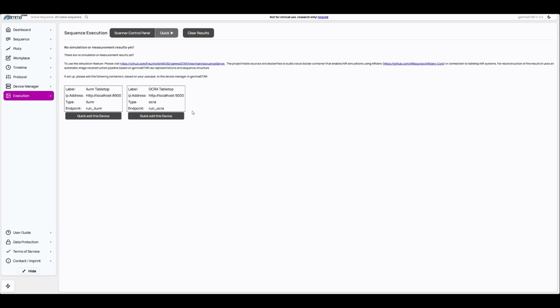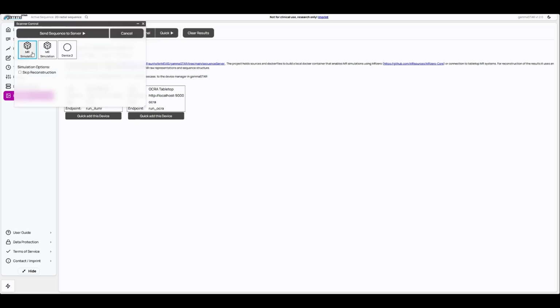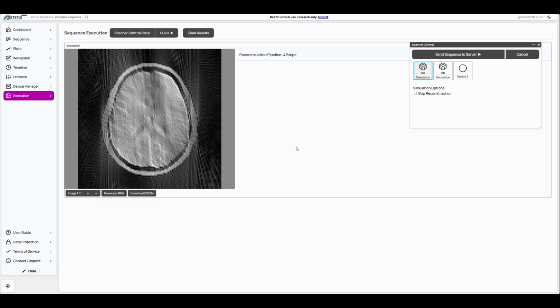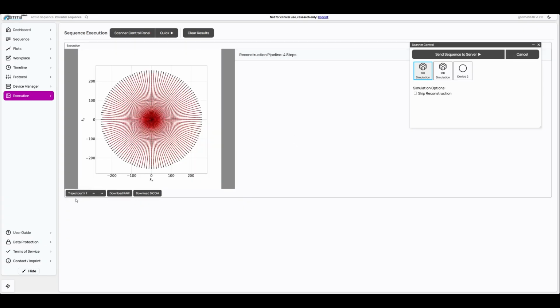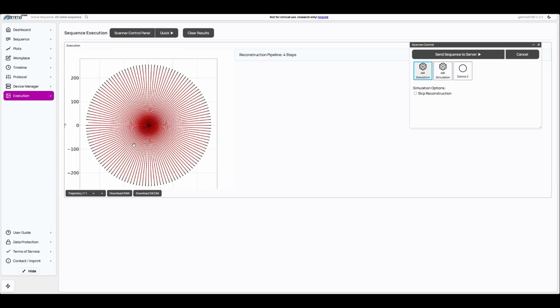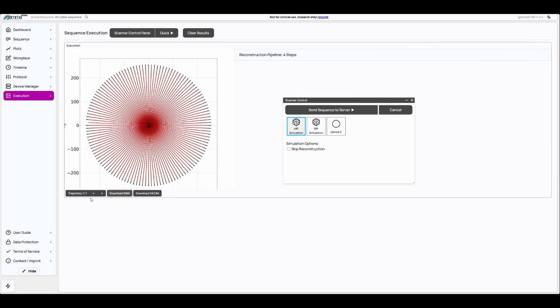And yeah, if we would just simulate that, we can also watch the k-space information, and what we see there is exactly what we've just described. So we start with readouts in the positive x direction until we reach positive y direction, and finally go back to negative y direction. This allows us to sample this whole radial k-space.